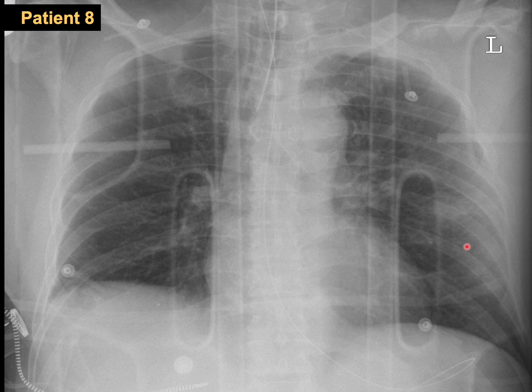A, B, C, D for, we said, the bones. If you look here, the clavicle is okay, but if you look here, well, there is a fracture of the left clavicle. If you continue, I think we can appreciate that there is some crowding here in comparison to here, with no obvious fracture line. Maybe here we can see. So A, B, C, D, E. We have a tube, we have NGT inserted, and it's in the stomach. We have the board, we have electrodes.